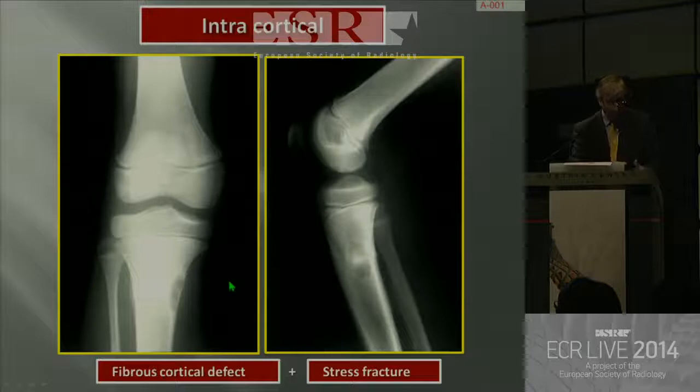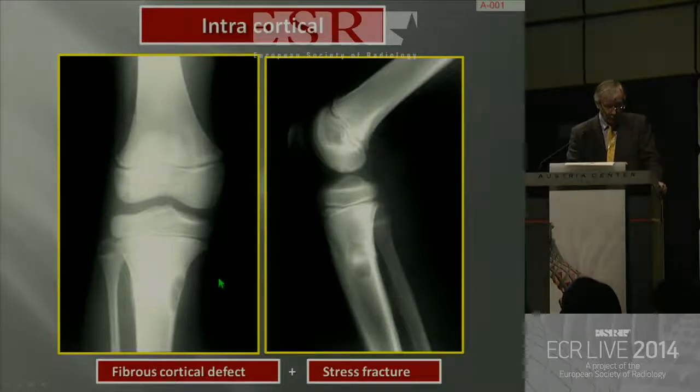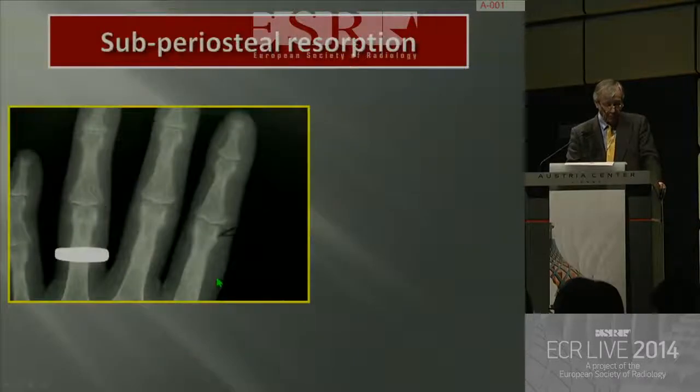So again, you've got two diagnoses. You've got to look carefully at the film and think clearly about what's going on.